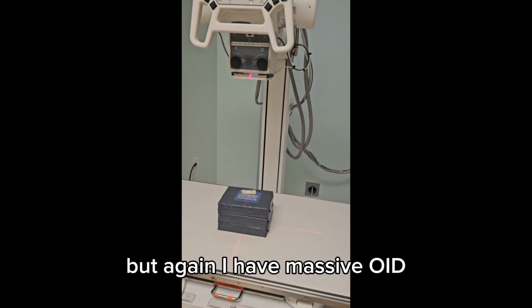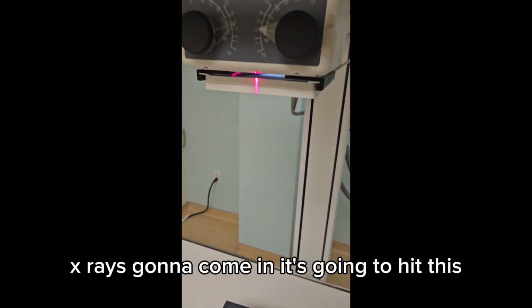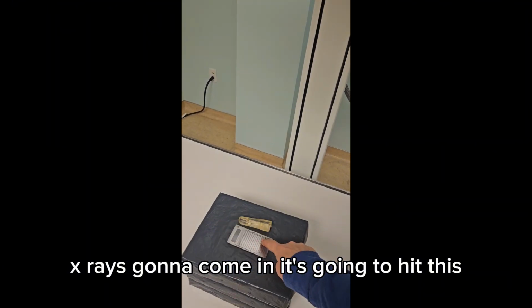But again, I have massive OID. So talk me through what's going to happen. X-ray is going to come in, it's going to hit this, and it's going to start scattering.